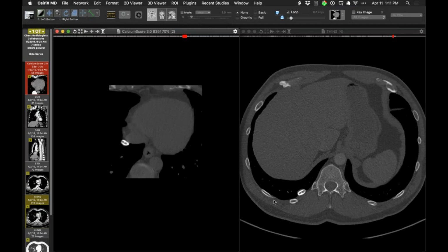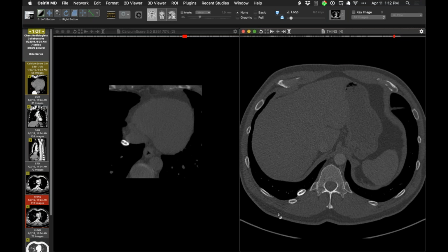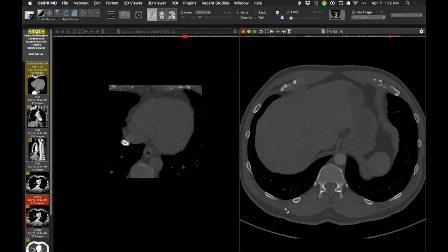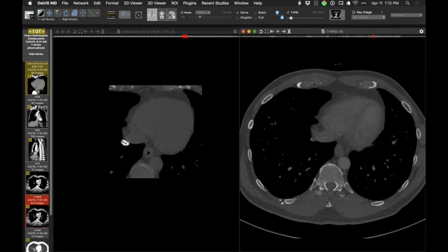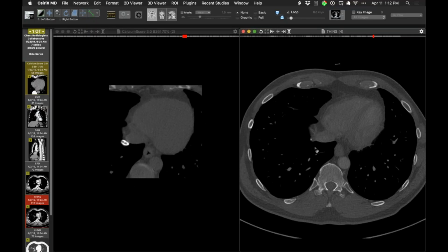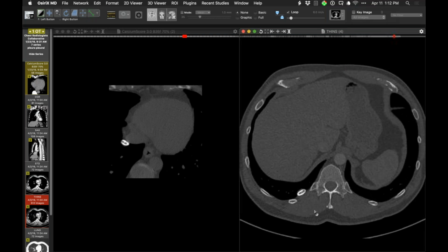Okay, so let me just go to the bone window. And isn't this, David, exactly like the one you showed like 2-3 weeks ago? Wow. A little cortex, a little medullary space or whatever, or at least fat in there maybe, but almost identical to the one that you showed. And I want to show you something really interesting, because when I go here and look where this was, you see there's still a little dot right there. Isn't that interesting? There's a little dot right there, maybe a little fat. So I wonder if it was sitting there, or it arose from there and then it fell away and ended up down there. But a super nice thoracolith.